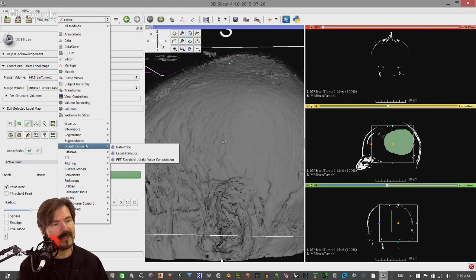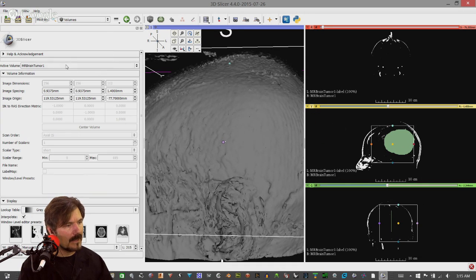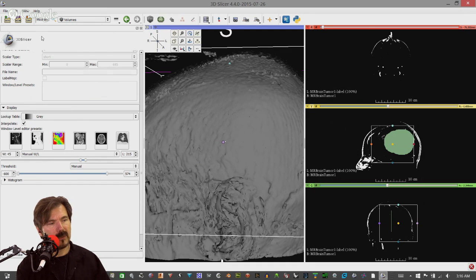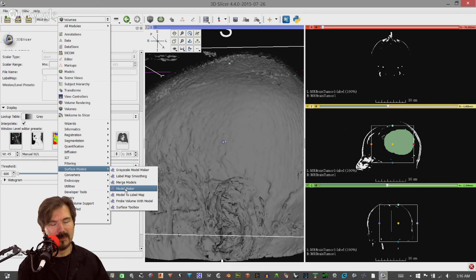It escapes me. But the answer to your question is, and I will bring it up later, Javin, yes, there is the ability to create an ROI specifically for the volume. And what it will do, if I find the right tool, which obviously I can't, is allow you to... So this is, at least to me, one of the problems with this application: there are so many selections that, unless you use them on a day-to-day basis, it's easy to forget some of them.